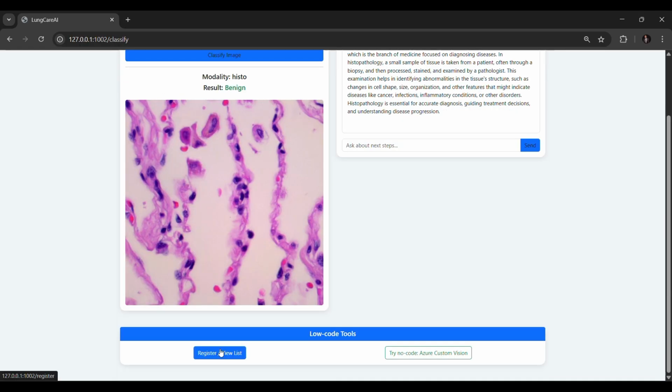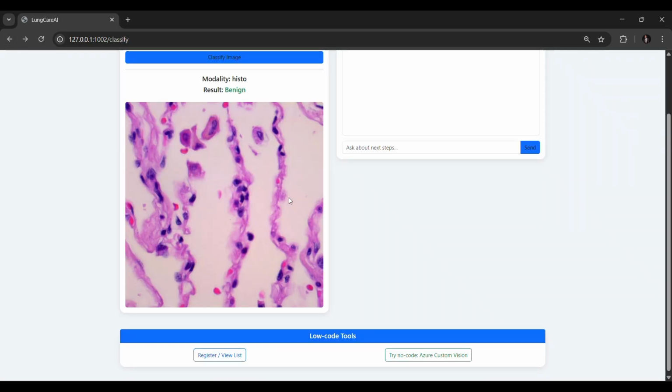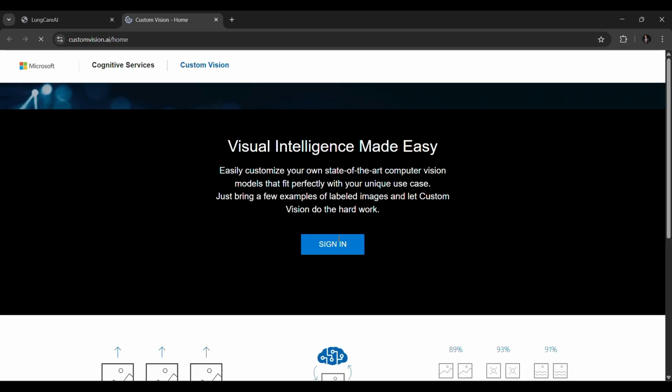Now to come here, we can easily use the Azure feature. If somebody doesn't really like a code environment, he can go for the no code. He registers and we send him his Azure credentials, so he too can log in and use our model. And hospitals, for example, can use this model in their various projects. So it leads them to the Azure Custom Vision portal.